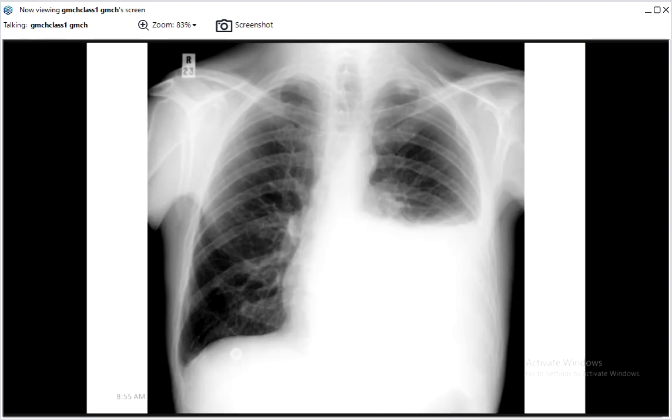So this is again the X-ray chest where we are having a radio-opacity. Okay. So what can this radio-opacity be? It can be consolidation. Yes, it can be consolidation, but it is not, because this is completely white and you are not able to see any air bronchograms in it. So what we are left with is either a collapse or a fluid collection. Now, how to differentiate between these two?